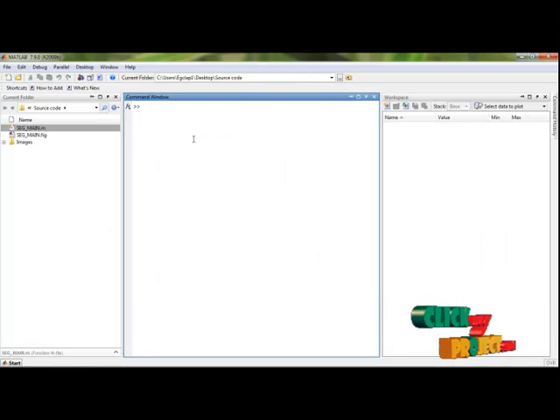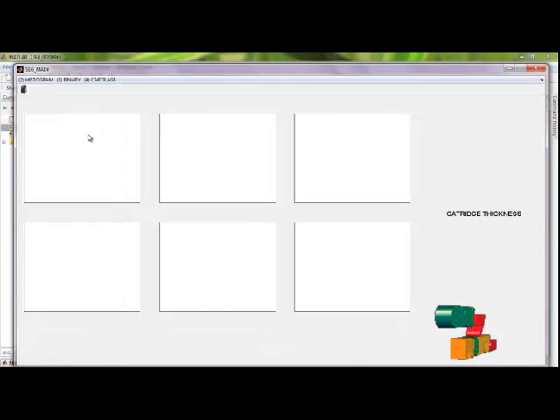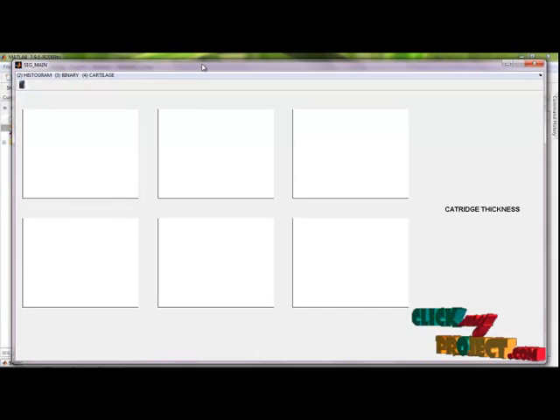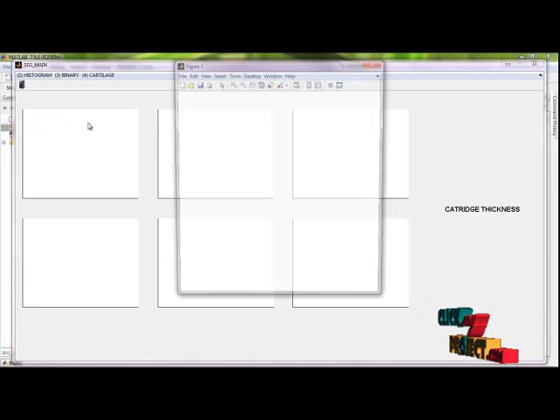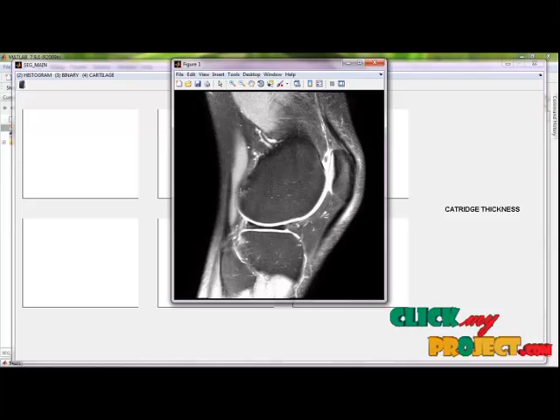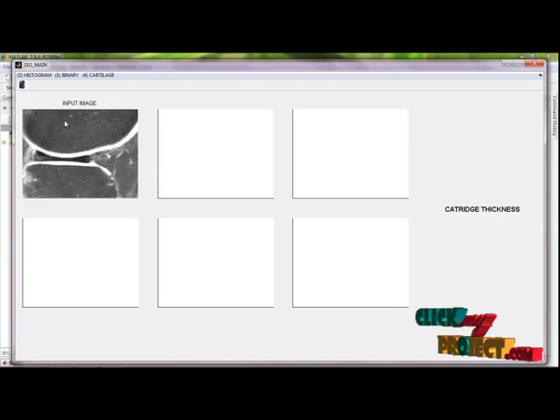Now I am going to explain the running process of our project. Now run the main.m file. This is the GUIDE window of our project. In the first step, I initialize the given image by clicking the Insert button. Here I give Ni004. I select the region. This is the selected input image. Now I plot the histogram value for the given image.